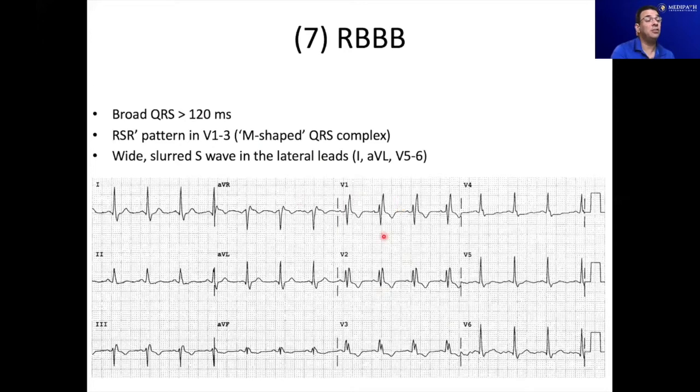And it's actually the ventricle. That's why you see it in the QRS complex, and that widens the QRS complex because you have electrical activities going at different times. That's the explanation. To find a right bundle branch block on an EKG, you look at V1 and V2. You should have a prolonged QRS complex, where it's greater than 3 little boxes or 120 milliseconds.